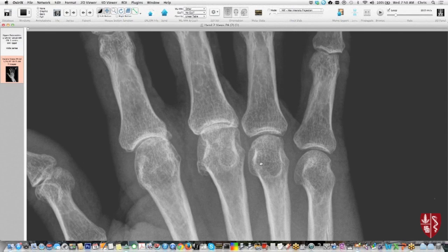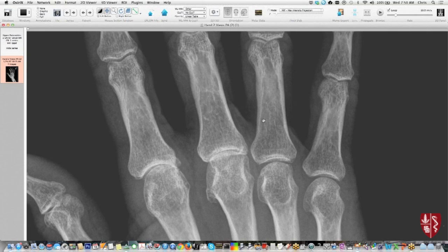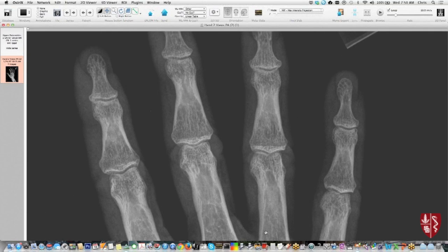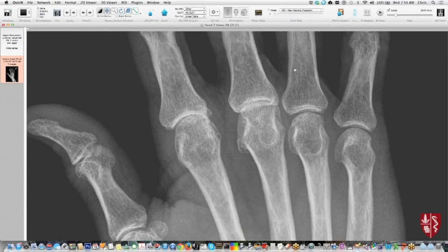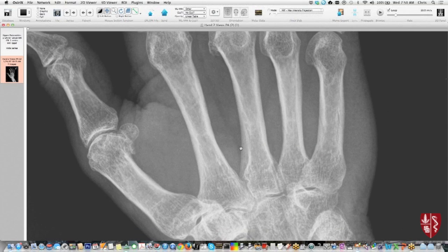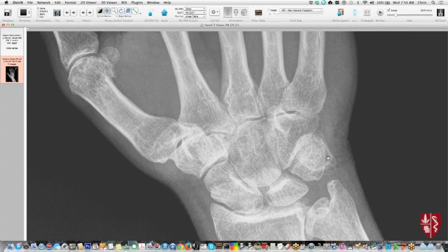So hopefully you all are thinking, oh, I know what that probably is, or what the tendency is for that. The mid and distal joints are pretty good. Some of these patients get pretty severe arthropathy here with a big overhanging kind of osteophytes, and this is pretty typical for CPPD arthropathy or pyrophosphate arthropathy. And in some of these patients, you can actually see chondrocalcinosis. In other areas, you don't have to have that. This patient doesn't really have chondrocalcinosis.